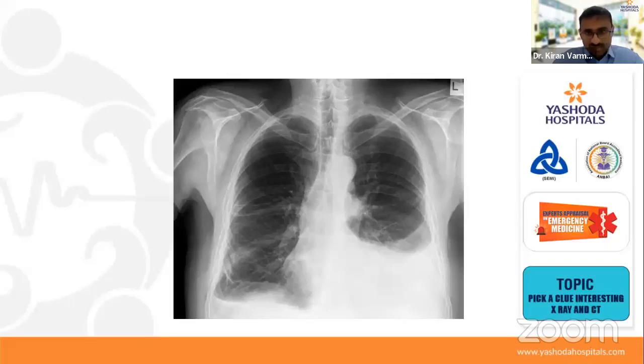Is it consolidation or effusion? Yes, effusion. Adil Afsal, Aisha. Dr. Baba, Anu. Yes, it is pleural effusion.